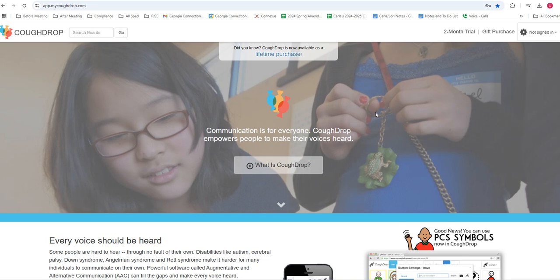Okay, so in this video, I'm going to give you a quick rundown on what Cough Drop looks like. Once you have your free trial or you've gotten your free account, your paid account, whatever it happens to be, today I am discussing more of the supporter account, which would be for a therapist or a teacher.